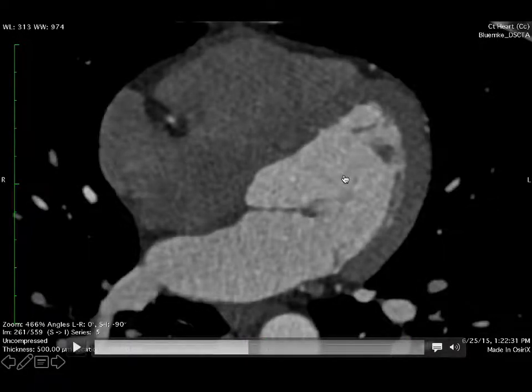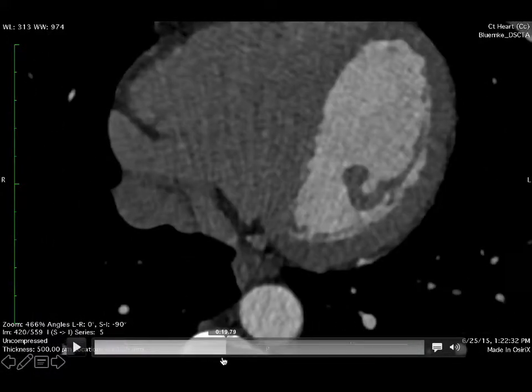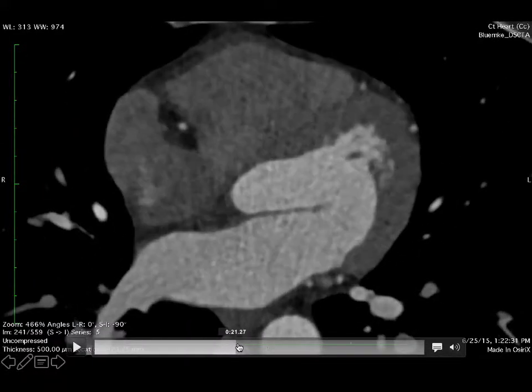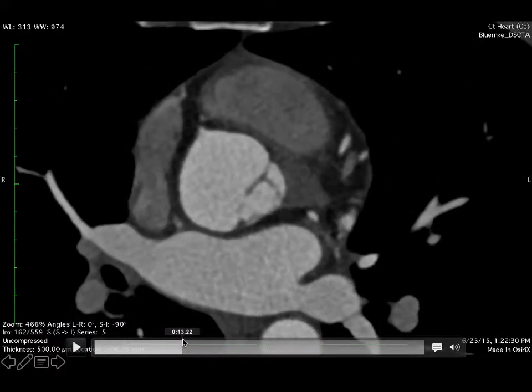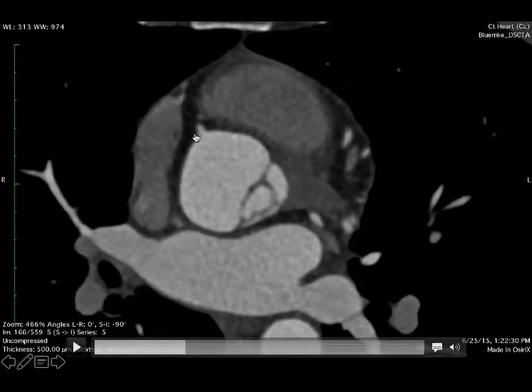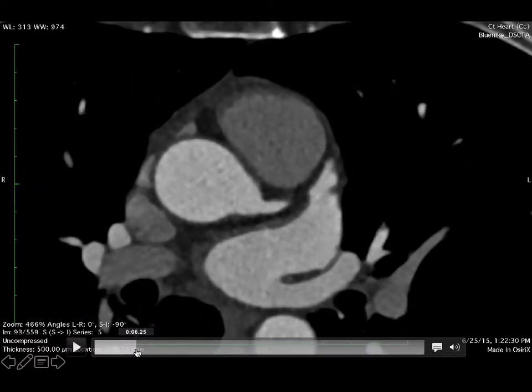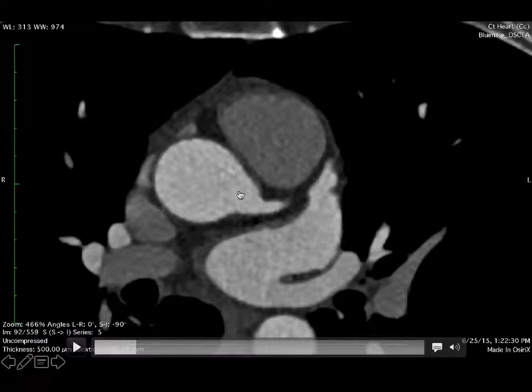Because it's in the left ventricle, and it's coming, if we go this direction, it's coming out the aorta. This is the aorta. It travels down the coronary vessels. Here's a coronary. The right coronary artery is coming off here. This person has quite a small right RCA. And this is the left main coming off the left coronary cusp of the aorta here.